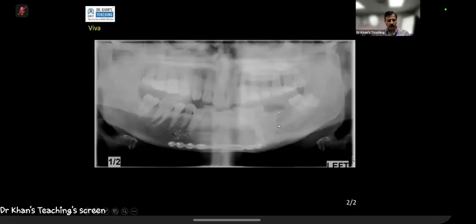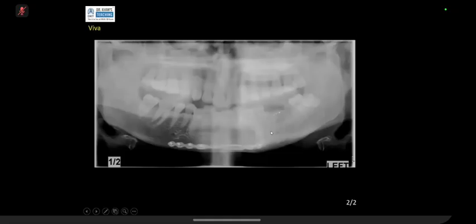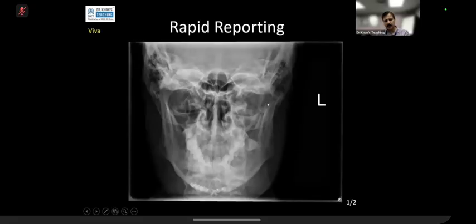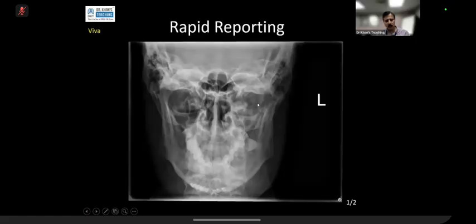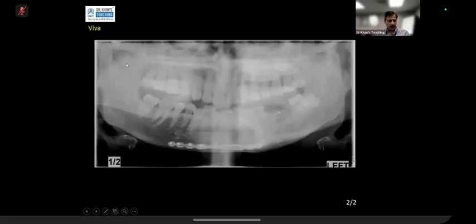Yes, please. Normal or abnormal? So don't worry about this because we knew this. It's abnormal, left-sided TMJ dislocation. Actually, this is the same patient. And interestingly, in this case, this was missed. Clinically it was evident, but radiologically somebody missed it. And then on the OPG, you can see it is sitting here, and this is abnormal.